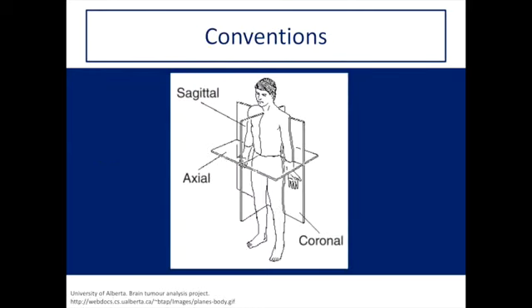So, just a little bit of an aside, many of you might know this already, but CT scans are generally obtained in axial slices. And then you can create reformats in any plane that you want from that source axial information. This image shows the most common reformats that are made, the sagittal reformats and the coronal reformats, and it shows what they mean as well.